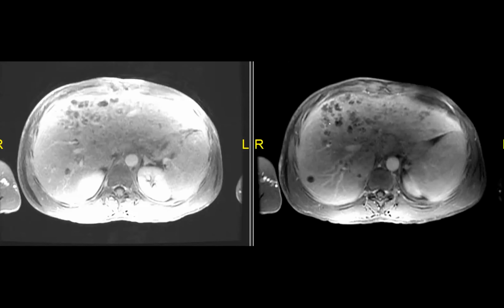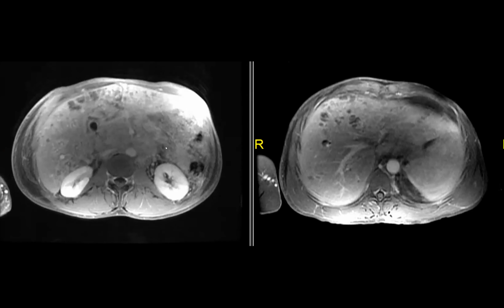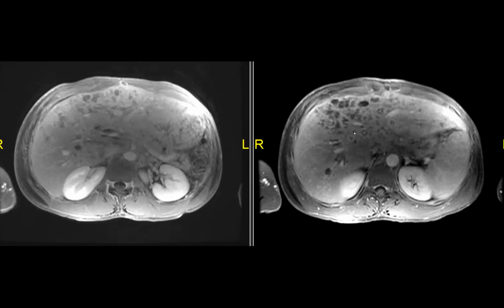When in doubt, right? And some of these are really discrete parenchymal lesions, right? Anyway, so we biopsied this. This is Kaposi. Isn't that crazy? Yes, actually, Kaposi loves the perivascular distribution. Yeah, I thought of it. Isn't that a crazy case?